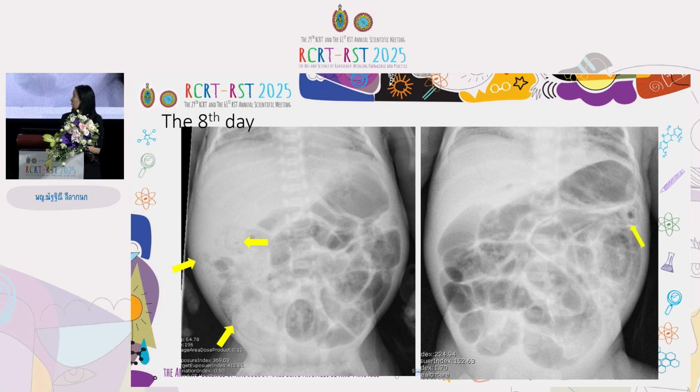And then in the evening, we see here portal venous gas. It's a little bit faint here. So we see pneumatosis intestinalis and portal venous gas. These are important clues for diagnosing necrotizing enterocolitis, which I will call NEC.